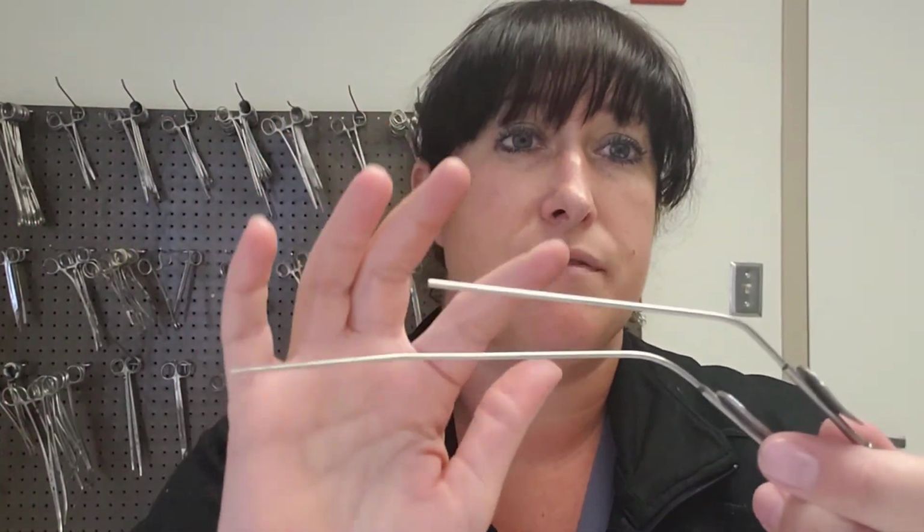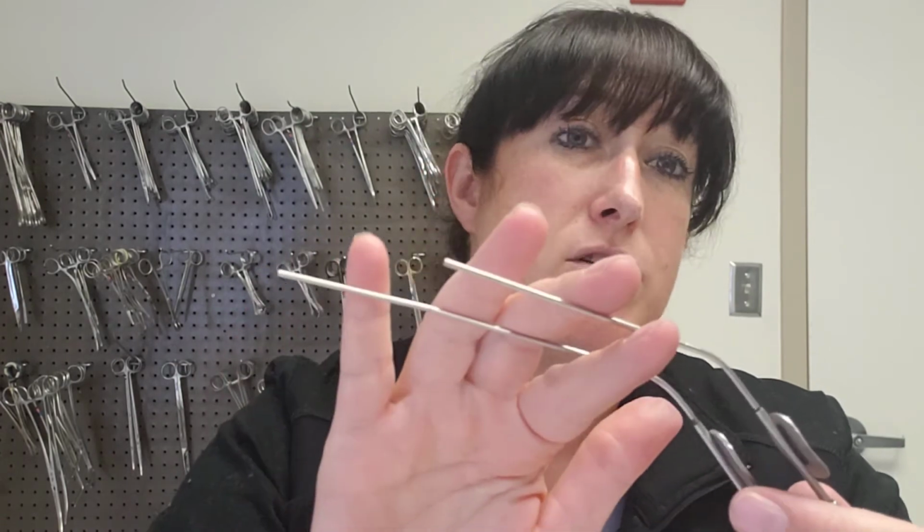I like free stuff. But anyways, these are both 5s, and probably what you're going to see more often, especially in neuro, is a 12 or a 10. And even though the 12 and 10 are bigger than these 5s, in fact they're double the size, they're still not going to be super big.